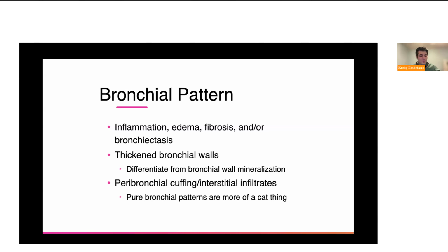Another thing to caveat, which makes it difficult, is that it's easy from the conceptual standpoint but harder in the practice of interpreting and calling things truly bronchial in a pathologic sense. It's the realization that, one, lungs look busy normally. Two, we have bronchial wall mineralization in older dogs and those with endocrine disorders. And three, you can have mild bronchitis with no radiographic features of bronchitis. So the reality is the sensitivity of radiographs for mild bronchial disease is not great.